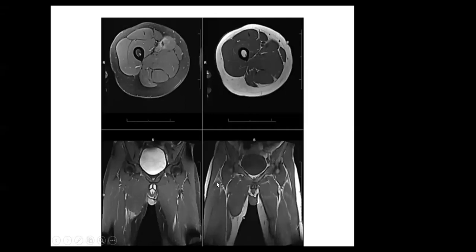So on MRI scan, we see this bunching up, and we know that it is a complete tear of the adductor longus muscle with some edema at the myotendinous junction. I think you call this a nerve. Actually, this is the retracted tendon, surrounded by edema. So this is a complete tear of adductor longus.